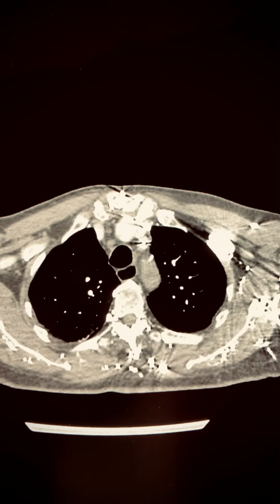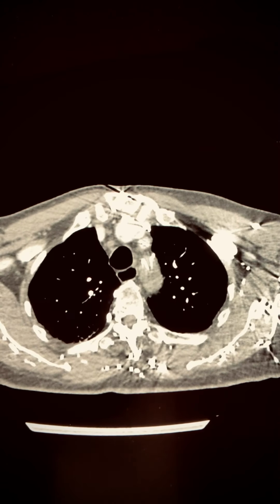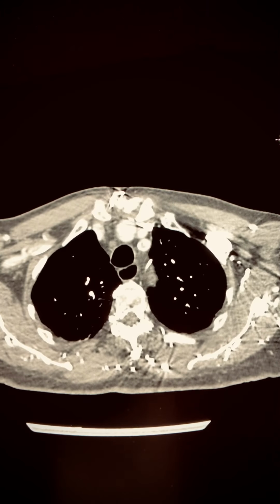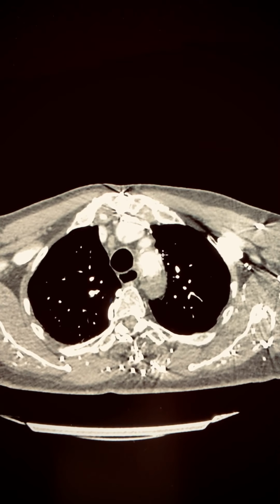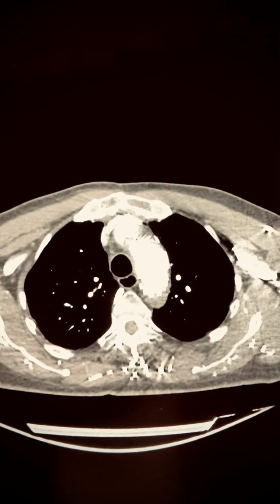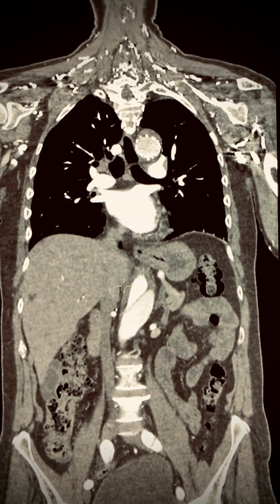The patient has had a previous dissection. To understand the principles of the TEVAR and its associated devices, we need to understand the orientation and the extent of the original dissection. If an aortic dissection is beyond the level of the left subclavian artery, it is termed a type B in terms of the Stanford classification. But even in such cases, such as this one, we would need to secure a landing zone for the proximal end of the graft.